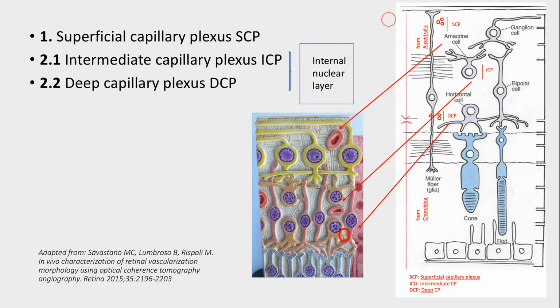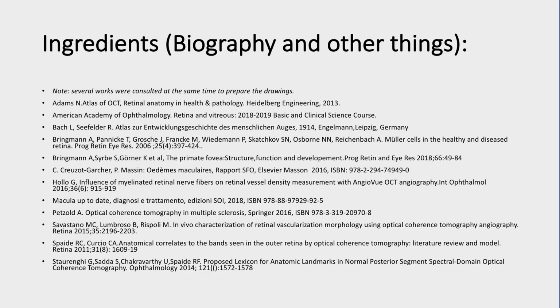And to finish, the retinal vascular plexus. Here, some interesting readings.